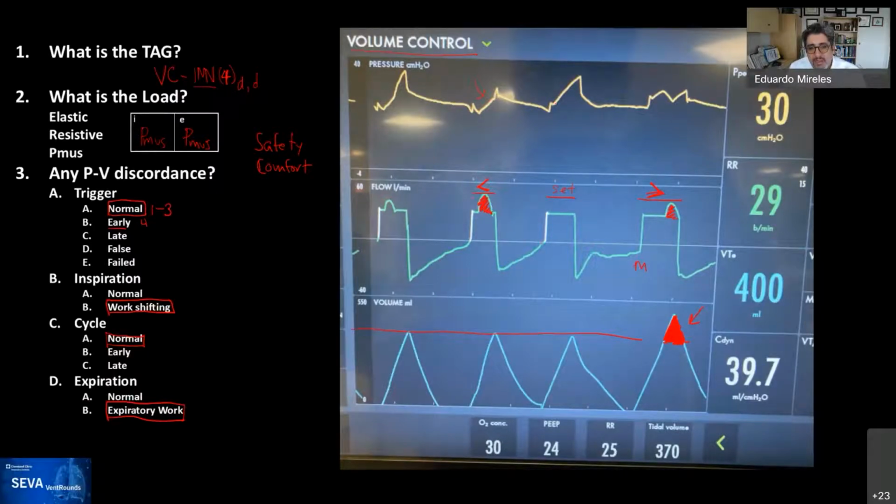And in this one, it still triggers the ventilator, but it barely deforms the pressure waveform. But all of them are normal except the last one, which is, as we said, mandatory followed by patient. It's an early trigger. And as we had said before, that doesn't mean reverse trigger. It just means that the machine triggered earlier than the patient. And there may be multiple reasons for that.